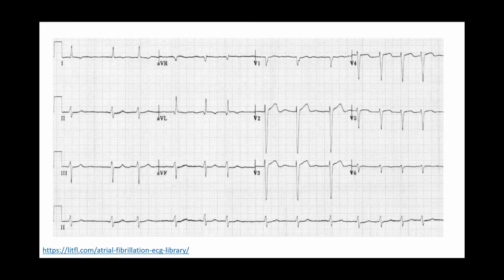So we've seen this EKG before. This is our EKG of atrial fibrillation. One of the hallmark features of atrial fibrillation is the lack of normal P waves. So you really won't see P waves in this specific EKG. We know just from that this rhythm is not sinus. So is this junctional or ventricular? Well, let's look at the pattern that the QRS complexes are occurring at.